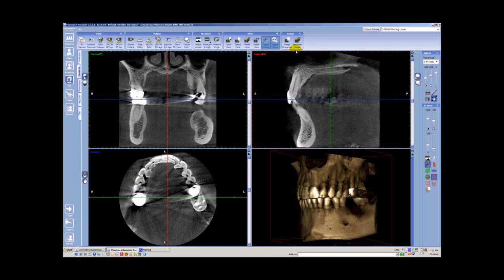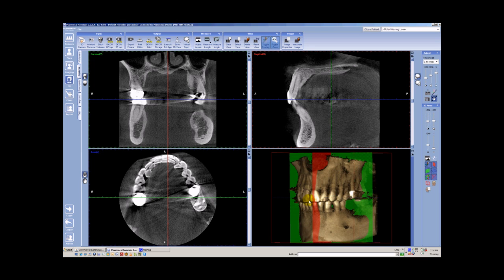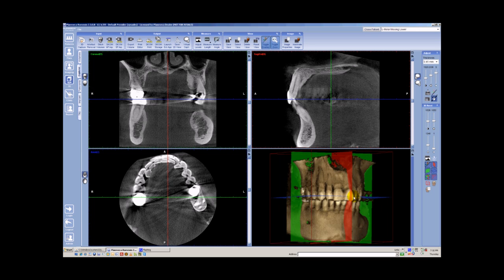Same thing on sagittal. Sagittal's red box, so that slice plane is being rendered from the red line. Same region. In the axial, the blue slice plane is being selected from the blue line. You can also see this represented three-dimensionally if you turn on the colorized slice planes, red, blue, and green. So in the three-dimensional window, you get to see where the slice planes are coming from.